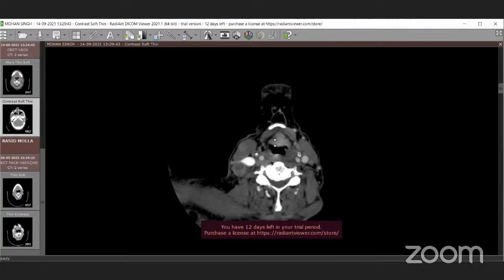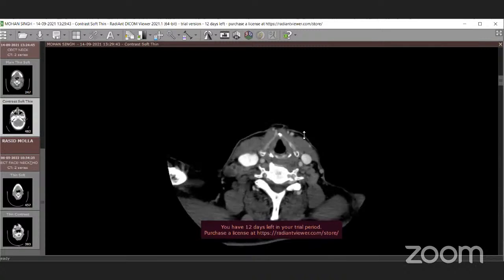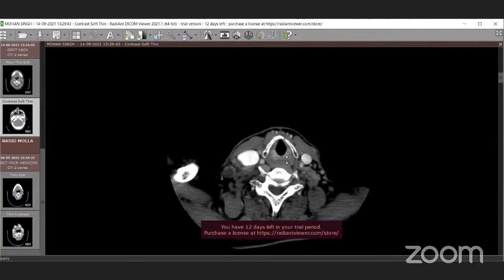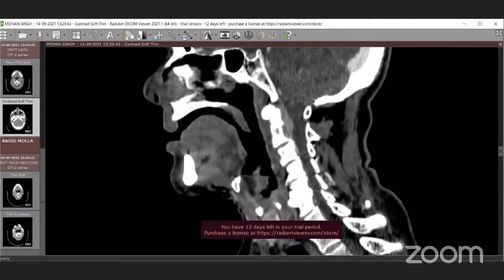Okay. The last thing I want to ask you regarding the post-cricoid region, you have told us it starts below the cricoid, but what would be the extent? Could you please show us? For the post-cricoid region, the upper margin is the upper level of the cricoid bone here, and as long as the cricoid bone is there, we call it the post-cricoid region. And this is better appreciated.